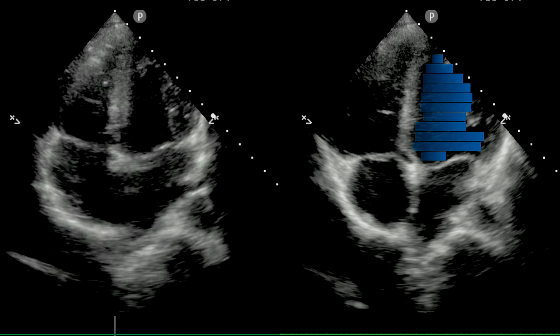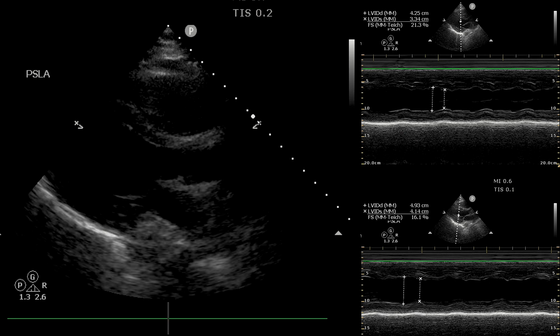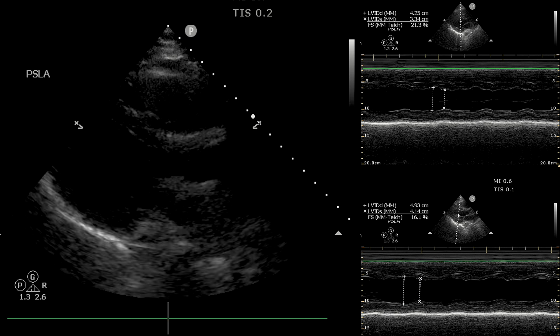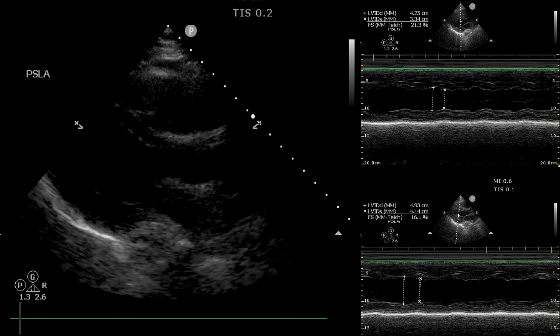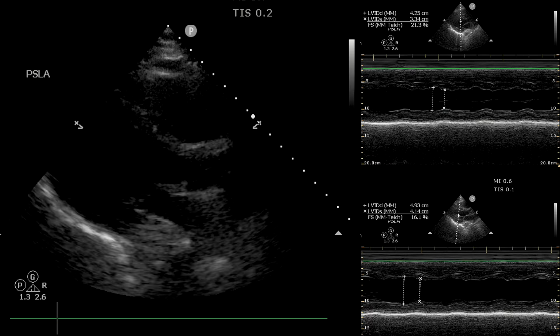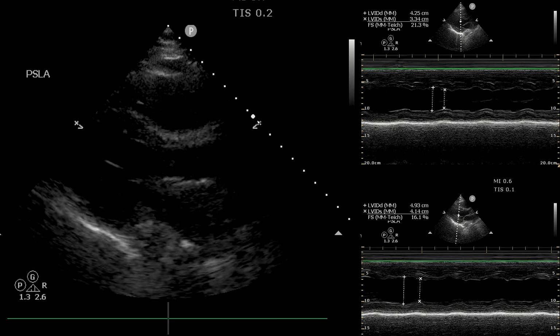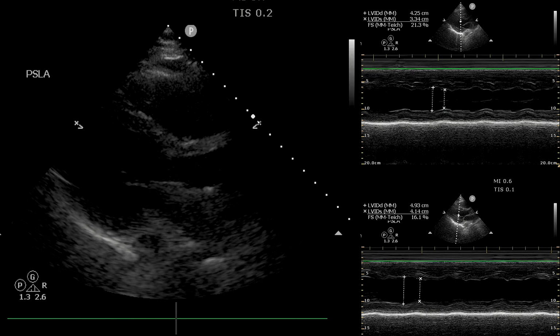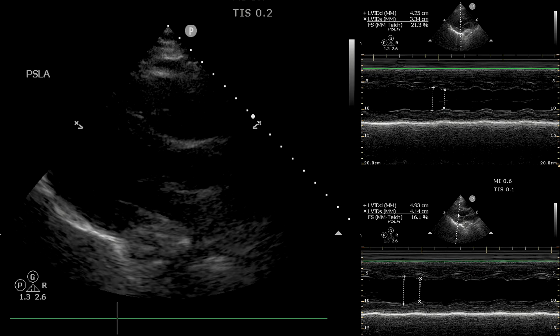And if we look last time at the fractional shortening, we're starting to get at that with this whole idea of the ventricle contracts. We see a change in the diameter, right? Endocardial border to endocardial border from the anterior to the posterior wall, and measuring that change in that length of the border of this heart.